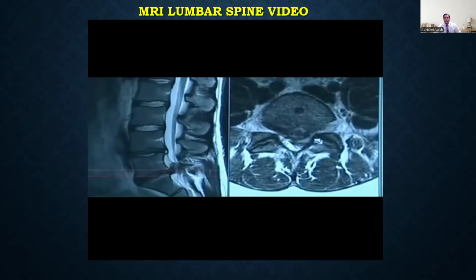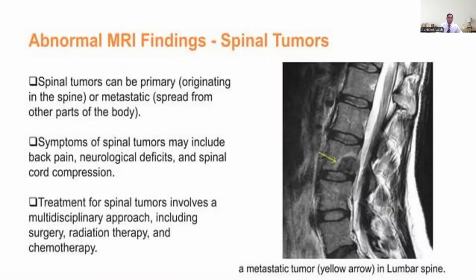So I hope this made a lot of queries cleared. This was a very good video showing how you should go about reading a lumbar spine MRI.